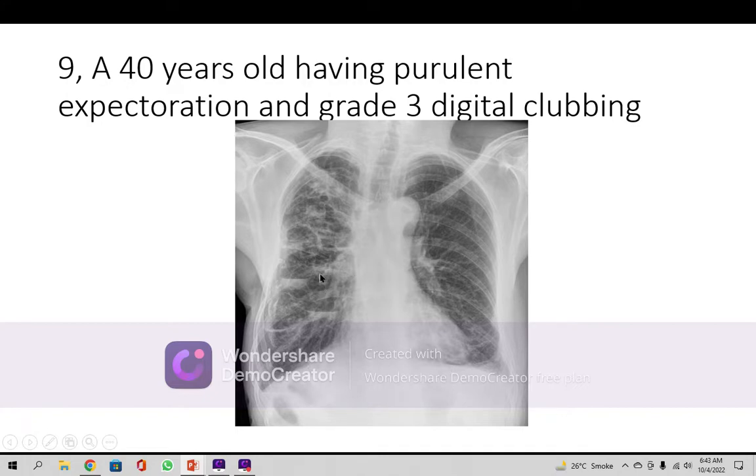The patient has got the COPD, and the element of chronic bronchitis is there, but it is more than the chronic bronchitis, because this part of the lung is much more severely affected with purulent expectoration, which means that he has developed another variant of chronic obstructive pulmonary disease that is called bronchiectasis, obstructive in nature. So bronchiectasis is the final diagnosis, other than the other differentials which I have already made.